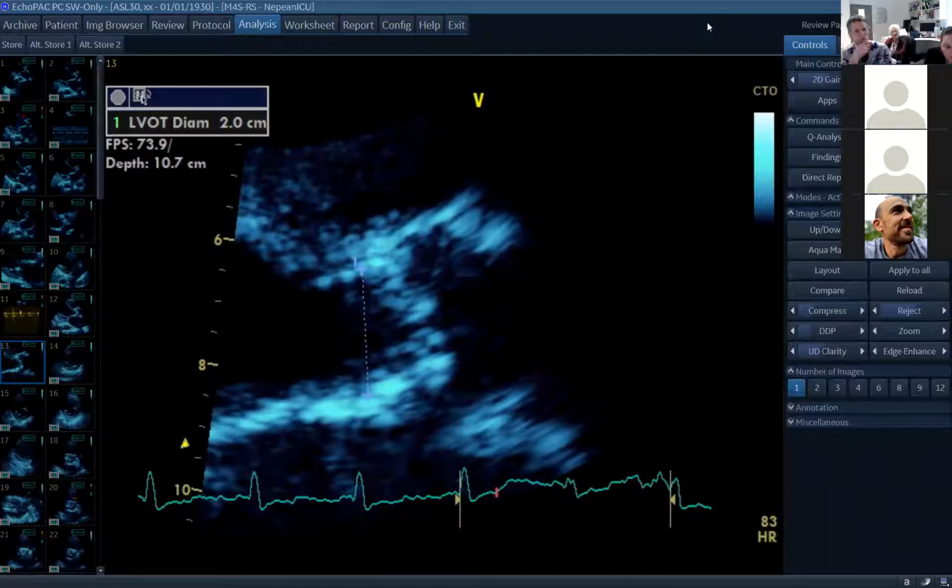Critique this image for me. So it's a measurement of the LVOT. It's very difficult to measure when the valve is calcified because it's hard to measure the insertion points of the leaflets. It's also hard to be sure that we're in mid-systole because we can't see the leaflets open because they're so calcified. According to the ECG, it would suggest that maybe we're beyond mid-systole, but they often don't correlate. The aortic valve leaflet opening and the ECG are not always synchronous. Nice. But the timing looks like it's a bit too late.